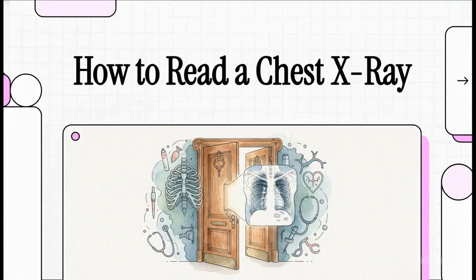Ever looked at a chest X-ray and just seen a confusing mess of gray and white? It's one of the most common tools in all of medicine, but let's be honest, figuring one out can feel pretty intimidating. In this explainer, we're going to break it all down step by step. We'll give you a framework to see it not just as an image, but as a detailed story about what's going on inside the human body.